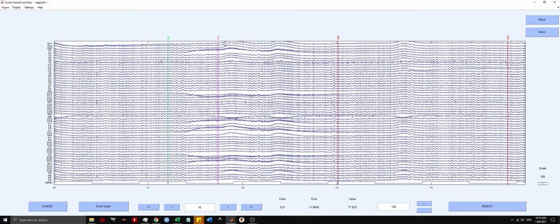Before we can proceed, we do have to exclude this final channel here, which is unused, and we have to relabel the EB channel, which stands for eye blink. We need to rename it to something that EEGLAB can recognize the position of.